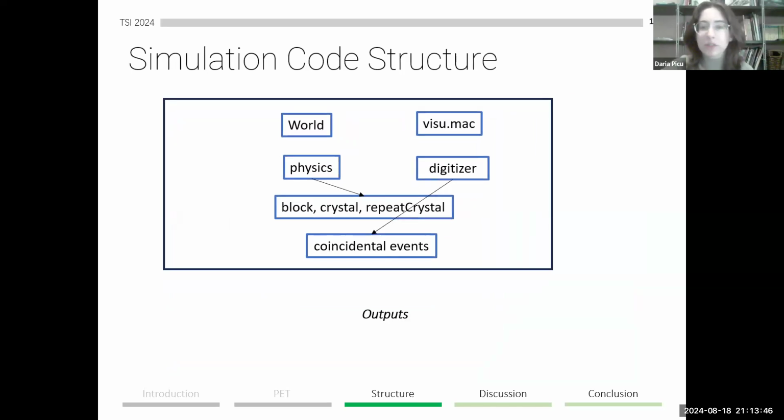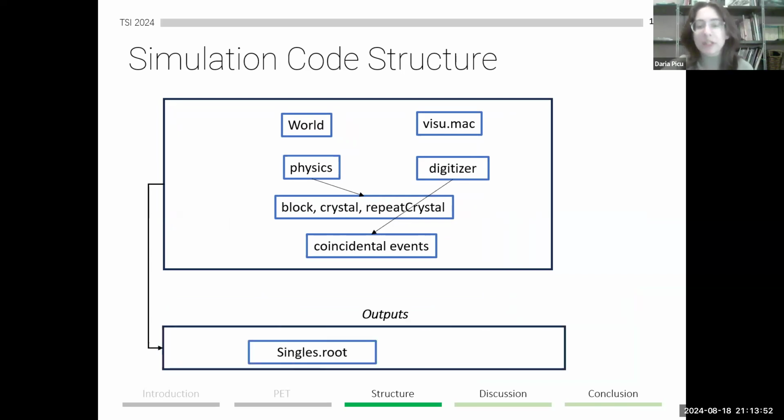The simulation is going to run for 1 second for acquisition, and then we're going to read and analyze the outputs using ROOT. For 1,000 gamma emissions during the simulation acquisition, we're going to record approximately 500 singles, which are then going to be stored into our ROOT file. Post-simulation analysis is going to use ROOT to generate various figures and also to help us find the detection efficiency. It's important to note that while GATE provides the calculation of coincidences, the coincidence sorter is going to be disabled in this report.